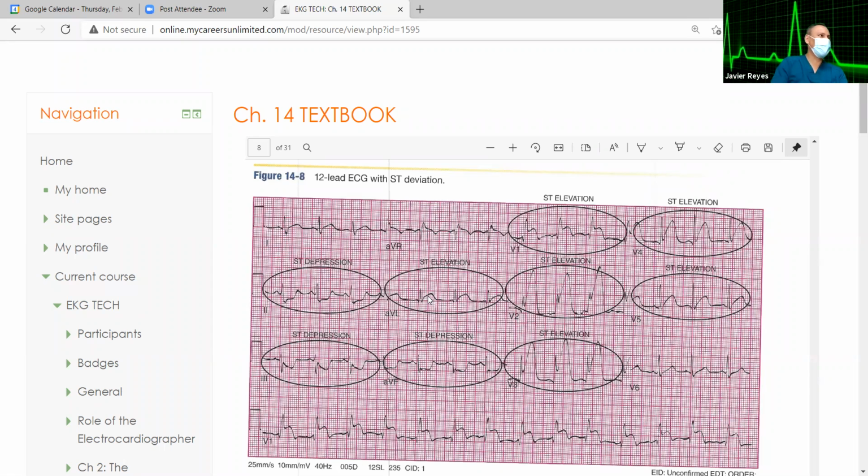Look, analyze the EKG. What do you call that section, Raquel? You have a P, a Q, little q, R, and then it doesn't come down. That means that you have what? Yes, that's the ST elevation. You said it, but you didn't say it loud enough. You need to speak louder. Don't be afraid to be wrong.